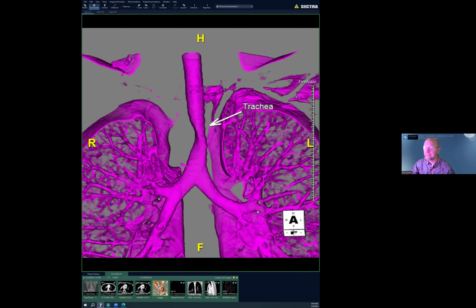And it is therefore very important to keep in mind that sometimes these patients, though they come with pulmonary symptoms, might have cardiovascular abnormalities. In this particular case, just for giggles, let's see if you can find in the bottom left corner of your screen the annotate button and put an arrow on the abnormality here.